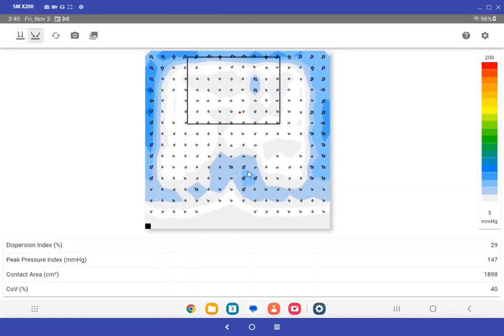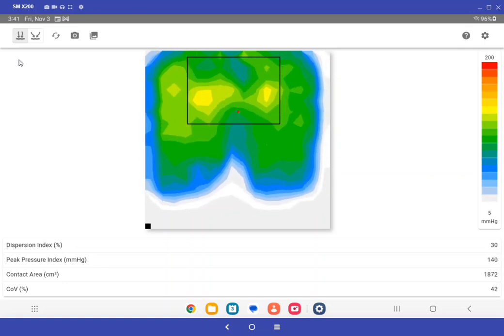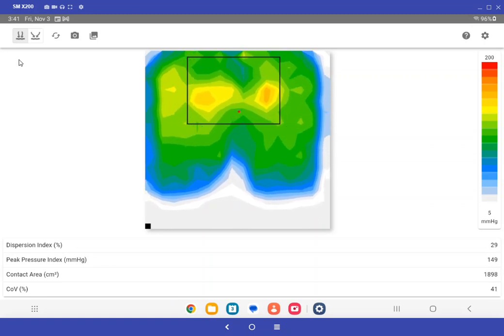A higher end tool perhaps than most people will use, and we really encourage people to stick with pressure unless they're really interested in gradient and shear. The fact is that if you do a good job redistributing the pressure so that there's no focused peaks, you've done a good job towards preventing any kind of shear activity happening on the surface.